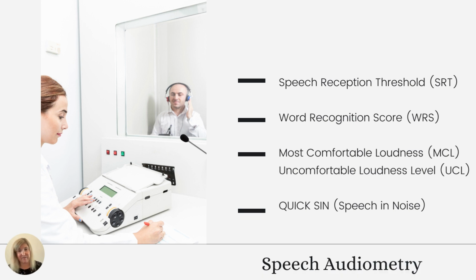Another series of tests that can be found during a hearing assessment includes speech audiometry. These can be conducted using the examiner's own voice, which is live, or through recorded material. The recorded material is preferable because it removes the examiner variables, such as a very high-pitched voice, variable speaking levels, or accents. The SRT, or speech reception threshold, refers to the softest level of speech understanding that the student heard 50% of the time.